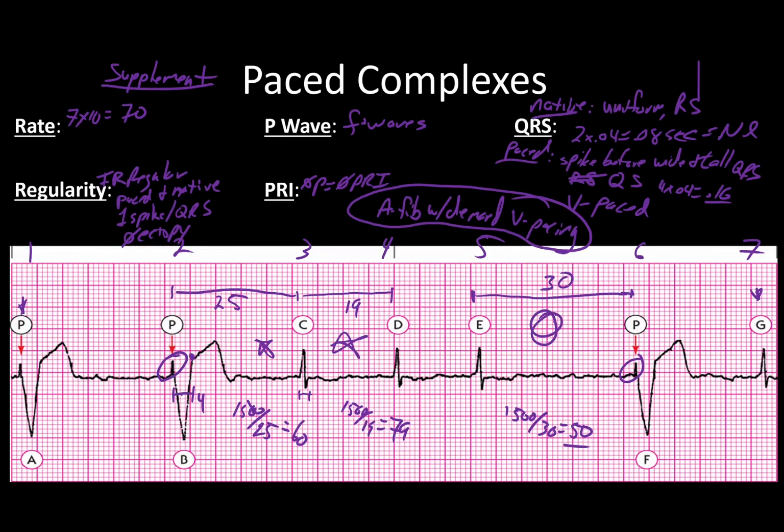The last question you may ask is, why does ventricular pacing cause, I'm going to look at beat number 1 here, such wide QRSs? And the reason for that is that a pacemaker is essentially just a wire jammed into the side of the heart. And because it's not part of the natural conduction system, it functions not unlike a PVC or something like that, where it's just causing a stimulus and it causes the rest of the ventricle to depolarize.